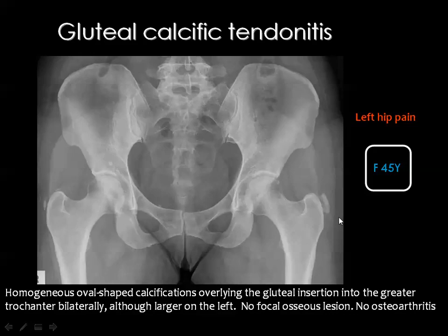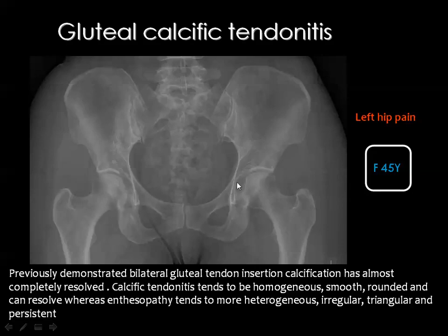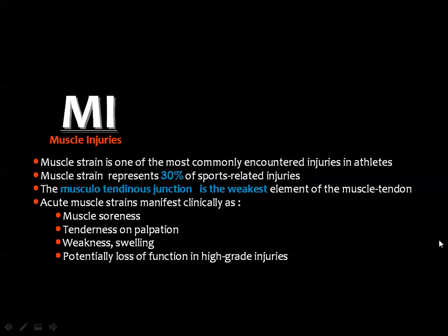And you can see here there is calcium bilaterally, and this is usually a self-limiting disease, meaning the calcium can resolve later on.